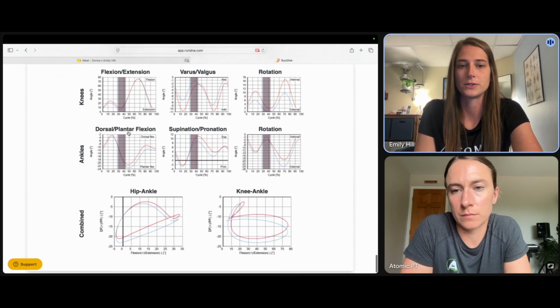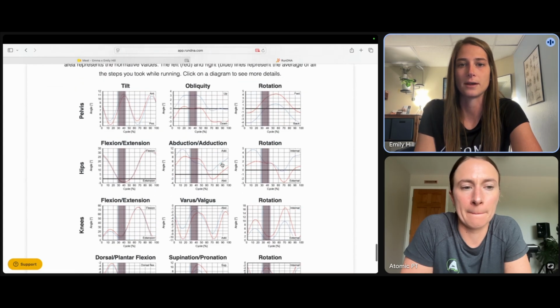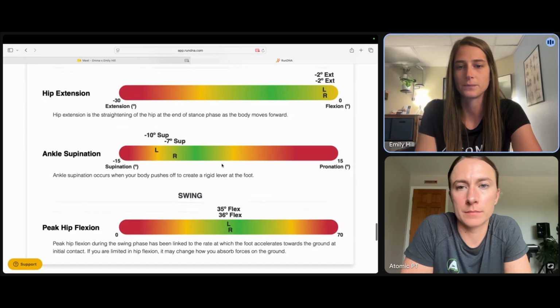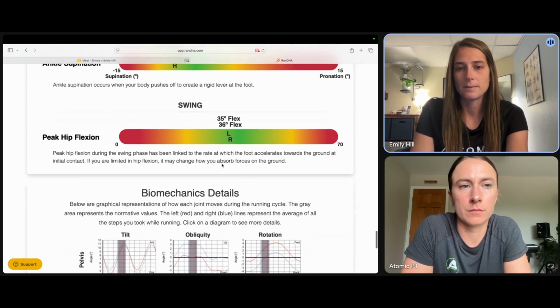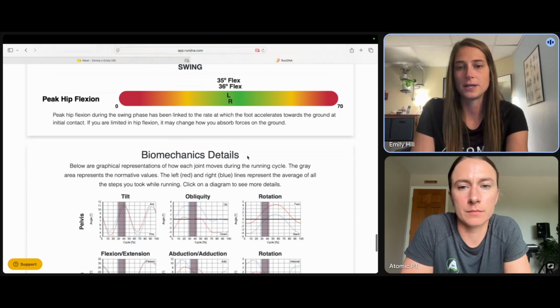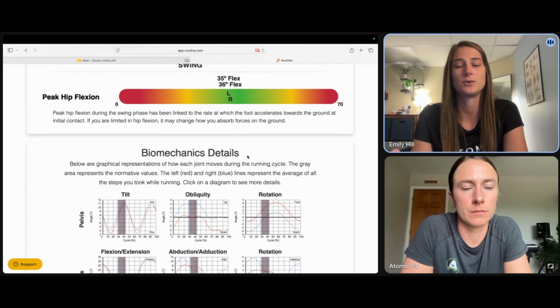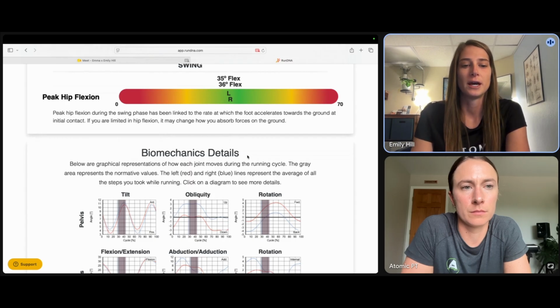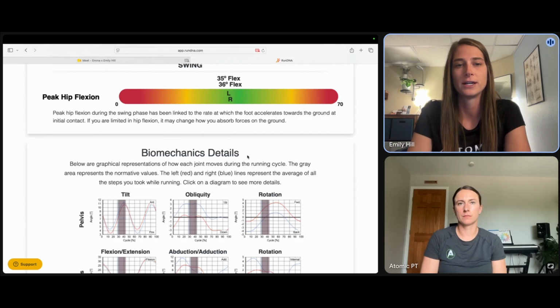And then those numbers are just confirmed as we look back up at the numbers that we went through up here. So knowing these things about Emma's run gait, there'd be a couple of things I'd be working on. First, we'd try some cueing for the overstriding. So I'd be talking to her about trying to land with your feet underneath you or trying to step a little bit quicker to increase that cadence so that she doesn't have time to land out as far in front of her.